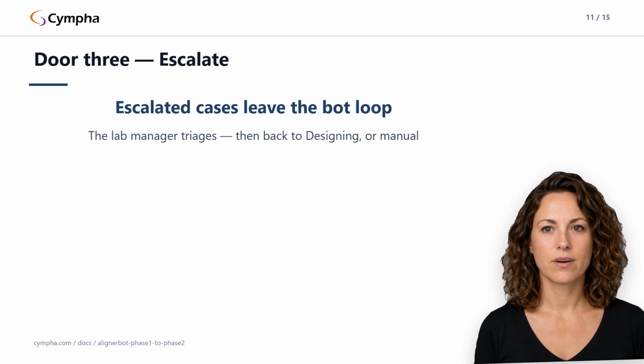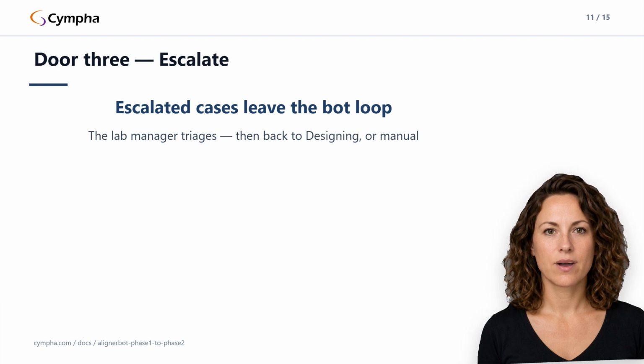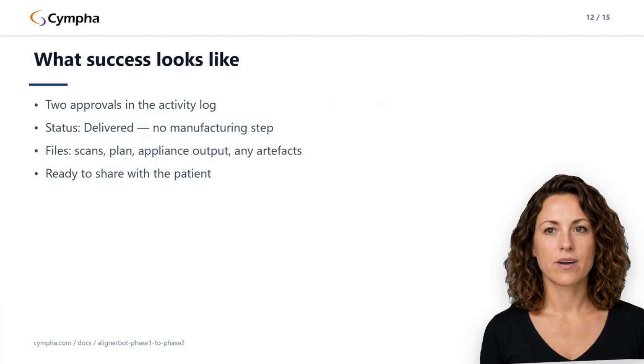Number 1, the case sits in designing after assignment, but Ortho Plus never opens. The cause is almost always that the case is held by a designer who doesn't hold the AlignerBot seat. Remember, the bot only activates for AlignerBot seat holders. The fix is to move the case back through designing so that it routes to the AlignerBot seat user and use the preview on the status control, which tells you who will receive it before you commit.